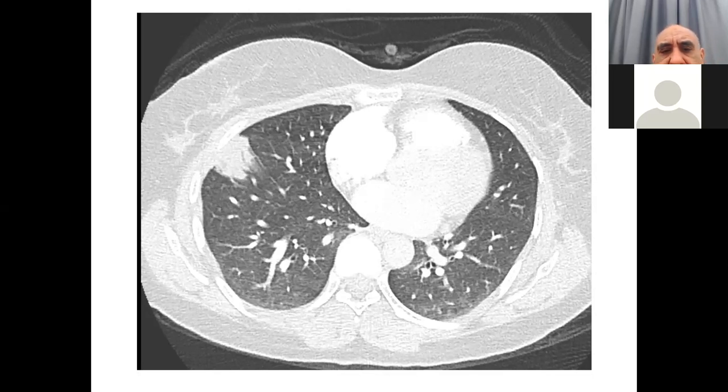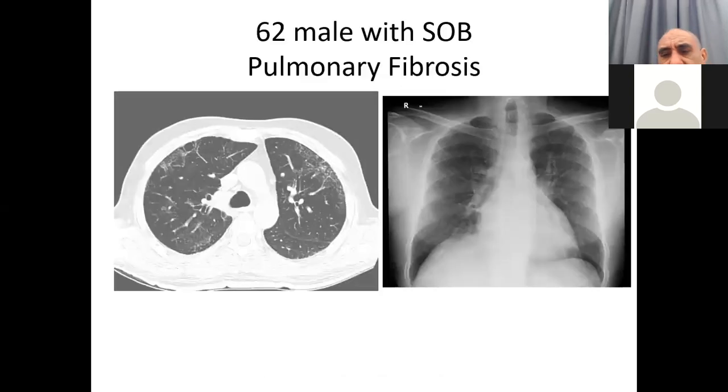We have three important X-ray or imaging signs of pulmonary embolism. The first is Hampton sign, which is a wedge pulmonary infarction. The other is Westermarck sign, in which the lung will be oligemic due to the pulmonary embolism and infarction. The third is Fleischner sign, in which the proximal part of the pulmonary trunk is prominent. So this is an X-ray of a patient with pulmonary embolism.